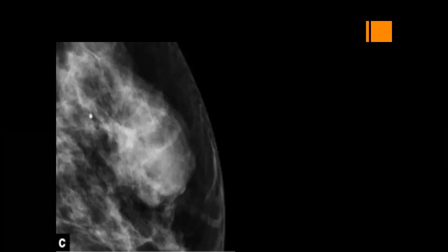I think this fat containing lesion is along the upper part of this obscured area. This large area containing fat represents BI-RADS 2. So you are going to report it as BI-RADS 2. Yes. That's why I brought this image.